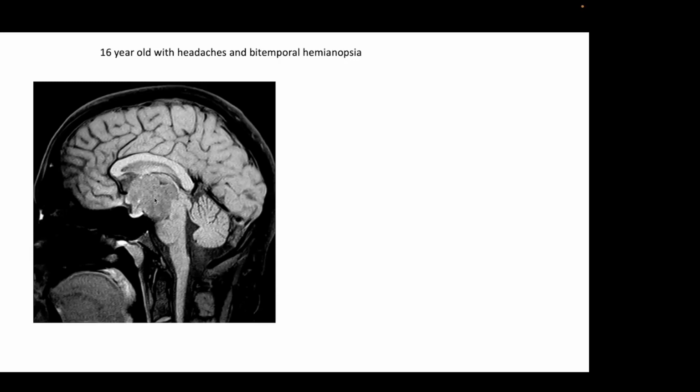Well, what lives in the suprasellar space? What travels back through that region? So the optic apparatus, right? So we want to think about, could this be an optic glioma? Or a hypothalamic lesion. Oh, yeah. So what would help you to establish the diagnosis of craniopharyngioma here?